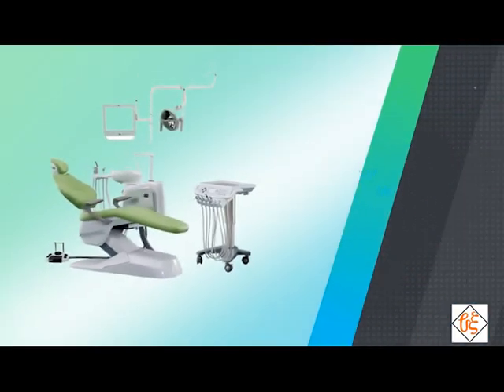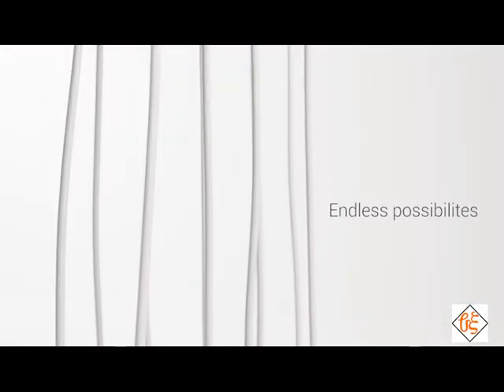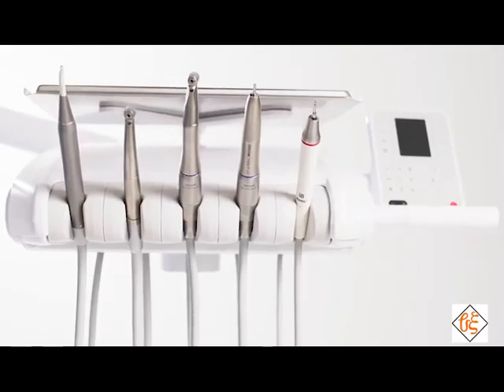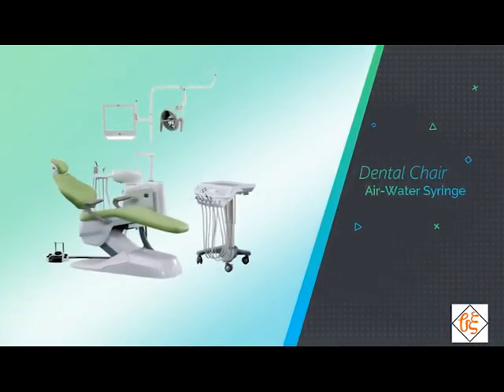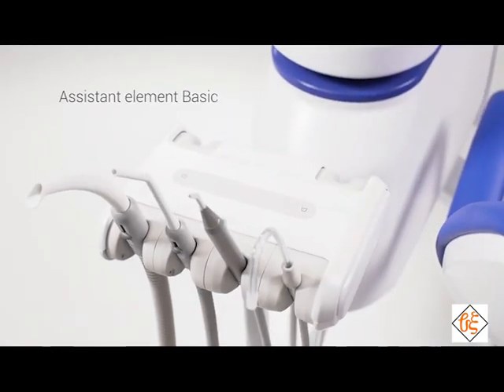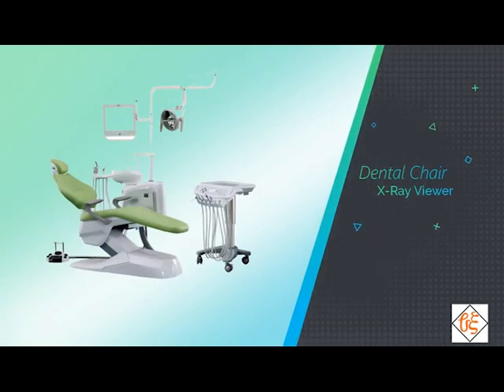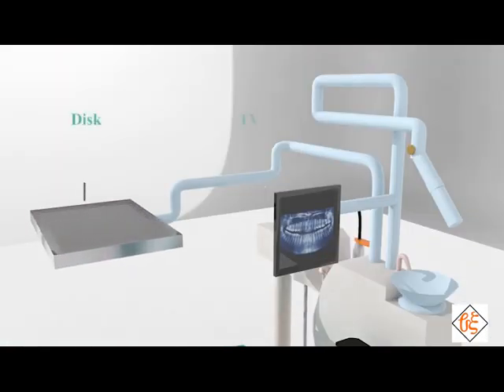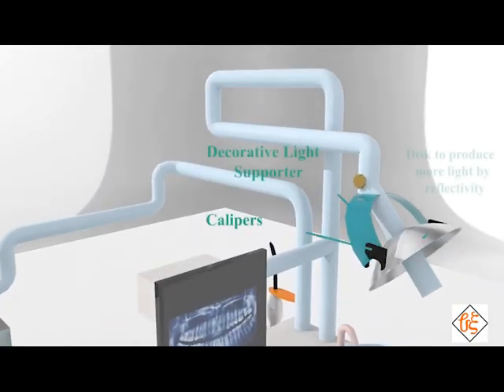The fourth component is bracket table. Bracket tables are used to hold hand instruments and materials such as cotton holders, cement mixtures, and diagnostic instruments, among many others. The fifth component is air-water syringe. The air-water syringe is one of the only dental devices that are used on every patient for every procedure. The 2 basic functions for this device are irrigating and drying. The sixth component is an X-ray viewer. X-ray viewers help examine and interpret the radiographs of a patient's oral cavity or tooth. They can help determine if there are areas of tooth decay or infection, which appear darker on the radiograph as they don't absorb much of the X-ray.